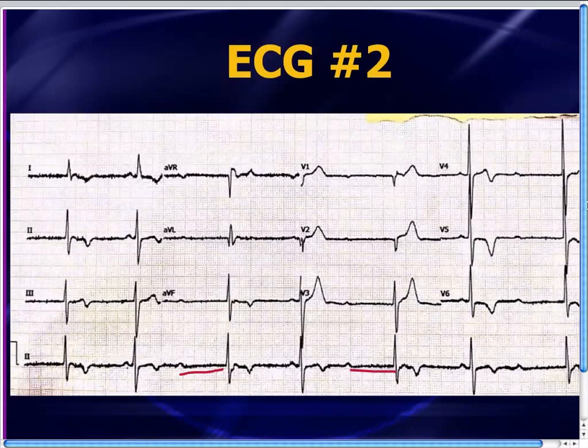At first, in fact, when I saw this rhythm initially, my first thought was that these must be junctional escape beats. The morphology is a little bit different also, but these are probably not junctional escape beats, because if you have junctional escape beats, it resets the sinus cycle, and the P waves would not be mapping out so perfectly. So these are not junctional escape beats. Those are just conducted beats. They might be conducted a little bit aberrantly or differently, which is what produces the QRS complex changes.